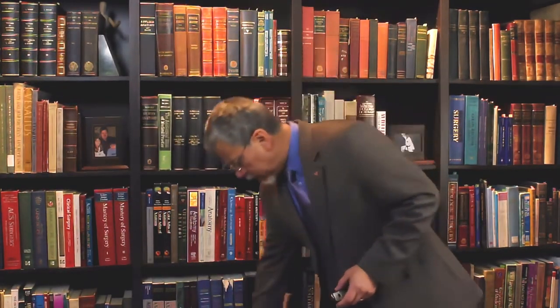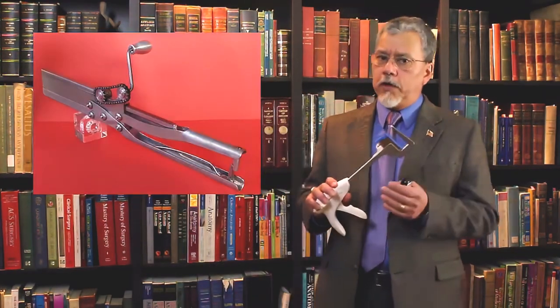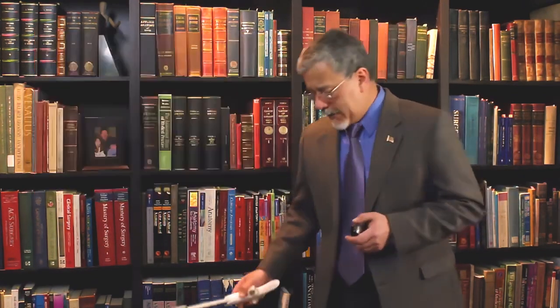The first one to actually invent and construct a surgical staple was a Hungarian surgeon, Dr. Humer Hültl. He developed this surgical stapler, and it was something like this. Well, not exactly like this. It was a linear stapler, but it weighed 15 pounds. And it was very difficult to use. But Hültl had several ideas that are used in the staplers of today.